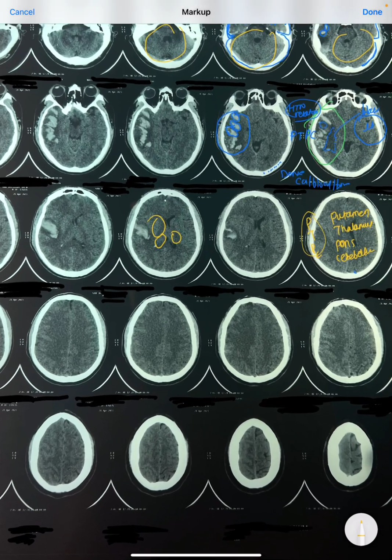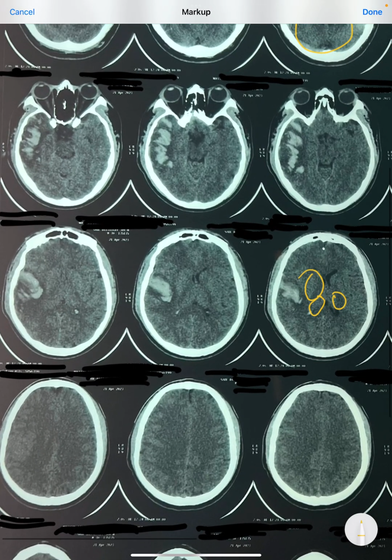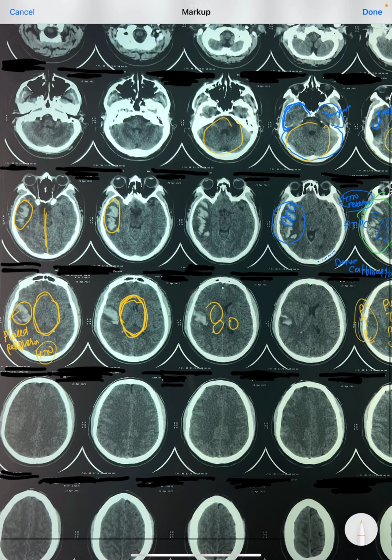And a main thing is this has to be a subcortical bleeding, but here it is a cortical bleed. It is almost placed outside the midline. So if it is a hypertension bleed, you usually get this bleed in this midline area, in this portion. But in this case, it is cortical or placed peripherally, which very highly suggests that this is not at all a hypertension related bleed. In a hypertension related bleed, there will usually be a single patchy large bleed. This can be like this.